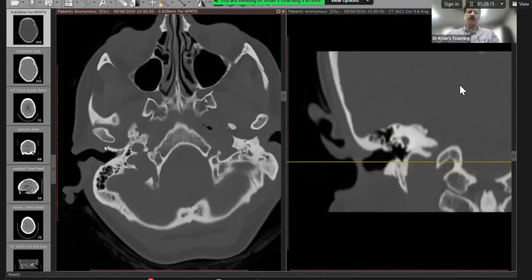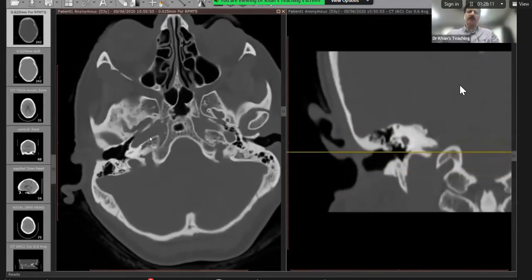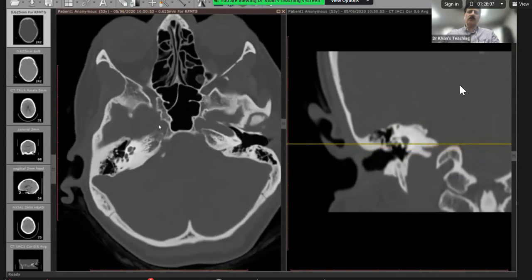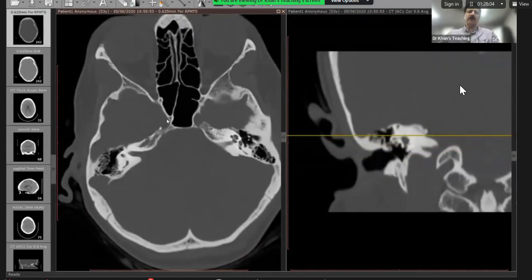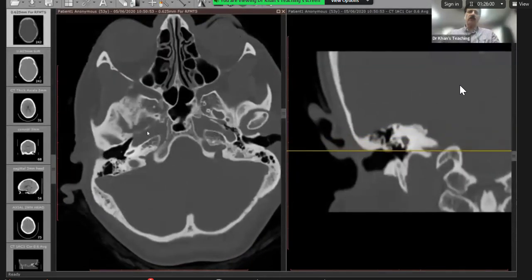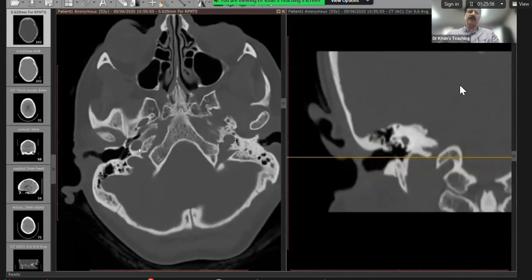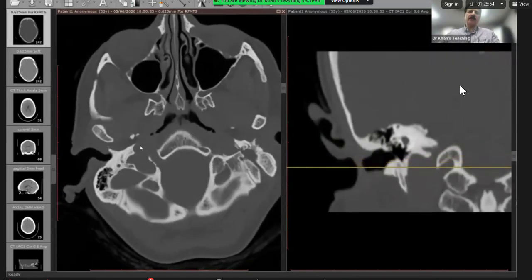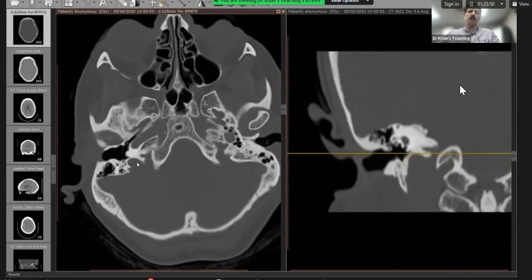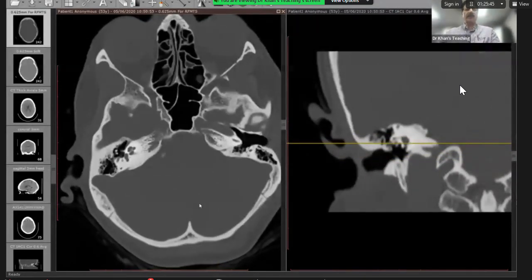Now, other surrounding structures, if you see here, this is the carotid canal. So this is the horizontal portion. If we trace it anteriorly, it will go into the cavernous sinus, which is sitting somewhere here. We are going posteriorly. And then this is the vertical portion. On the other hand, this is the jugular foramen. So this is the anatomy.